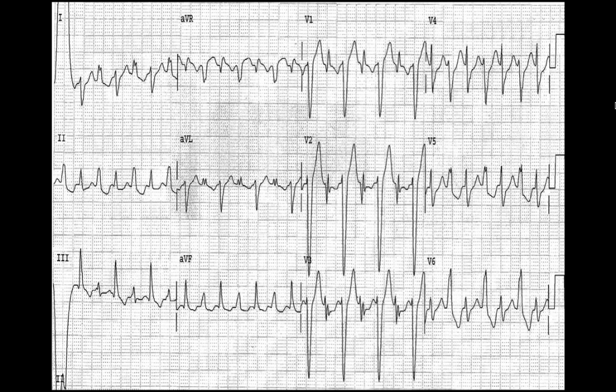Here's a great example of that, this 12-lead EKG of this patient. We are flipping our axis 180 degrees. If you look at our bundle branch blocks, we're flipping from a left bundle to a right bundle and back and forth and back and forth. Same thing with lead 1. You can see we're flipping from a negative complex to a positive complex to a negative to a positive and back and forth. So we're flipping our axes as well. This is a bidirectional VTAC.